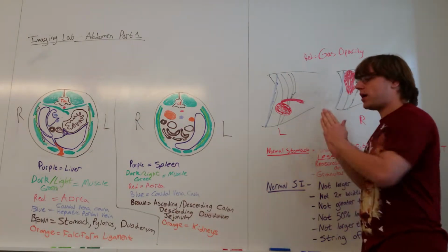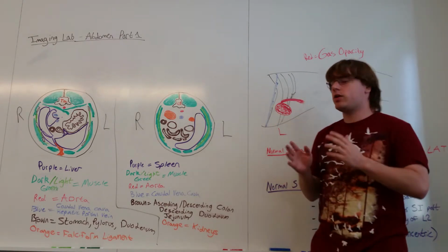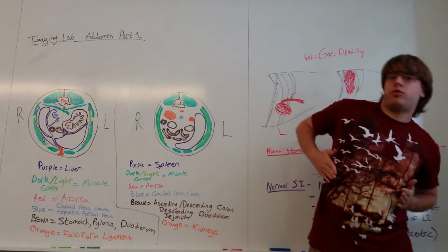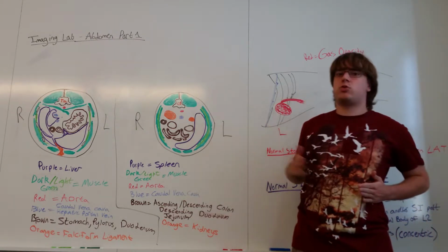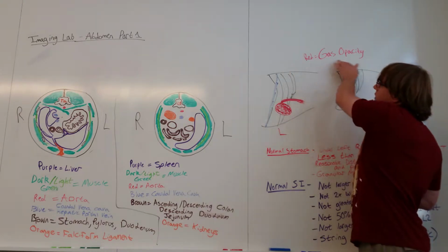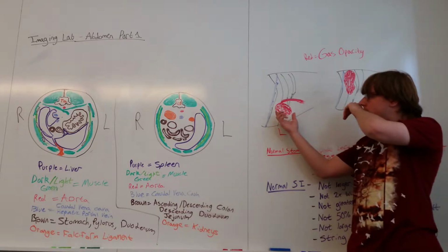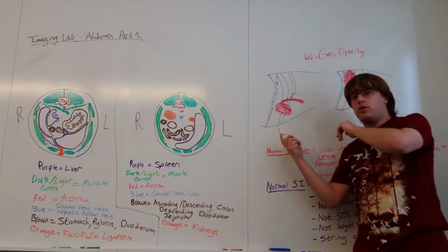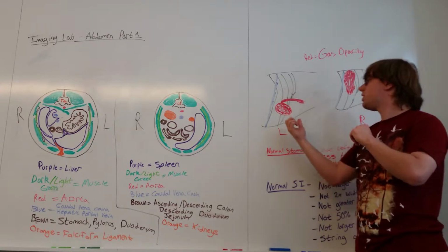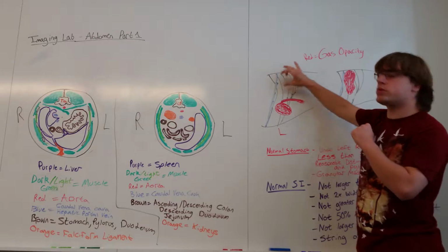So the pyloric part of the stomach is a more right-sided organ. If you were to lie on your left side, then the gas would float upwards towards the right side, towards the pylorus. The red here represents gas opacity. You should see on a left lateral view the pylorus being filled with gas, and then you might see some fluid opacity up more dorsally.